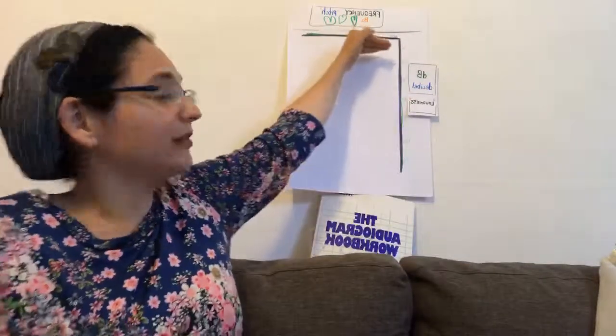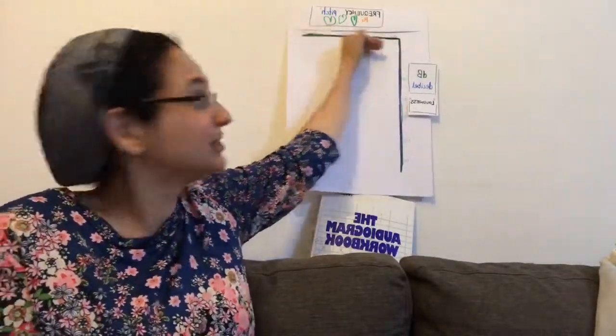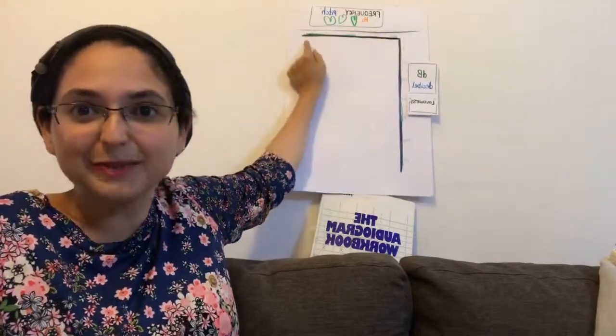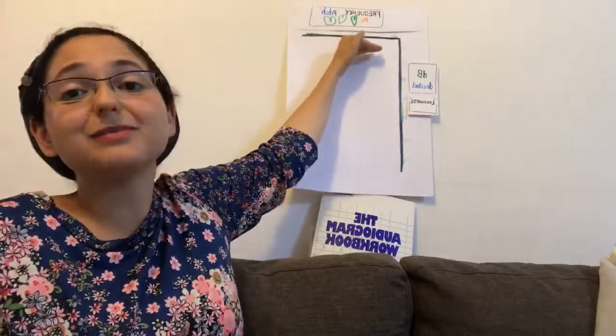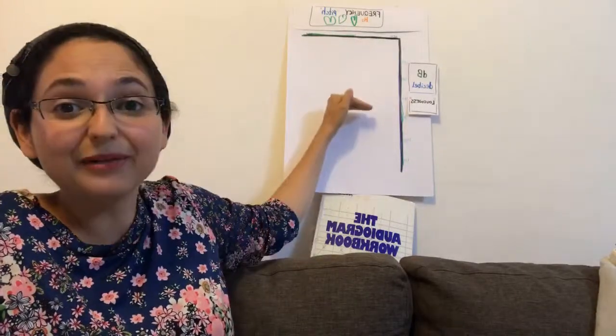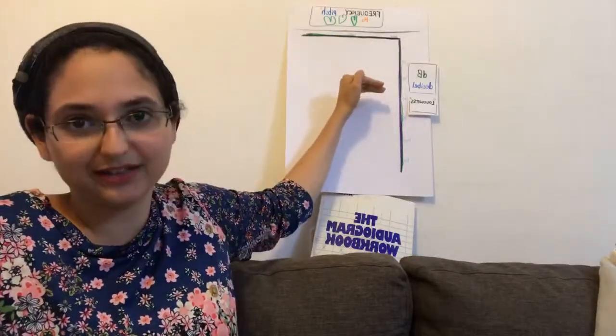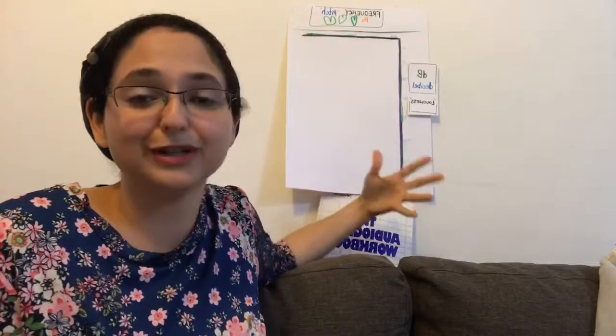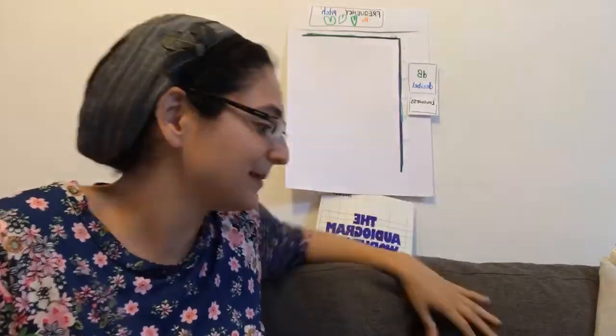And so if you can hear them when they're super quiet, which is right up here, then they'll mark down the responses up here. And if they have to make the sounds louder before you raise your hand, louder and louder and louder, then that's how much hearing loss there is. So the lower down on the graph you are, that corresponds with more hearing loss.